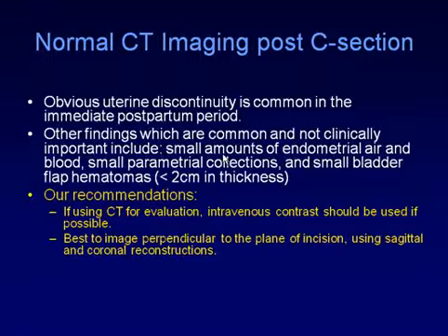In addition, it is best to evaluate the uterus perpendicular to the plane of the incision, and typically that requires making sagittal and coronal reformatted views of the uterus. So it may be quite difficult to interpret what is exactly happening in the axial images that come from the source.